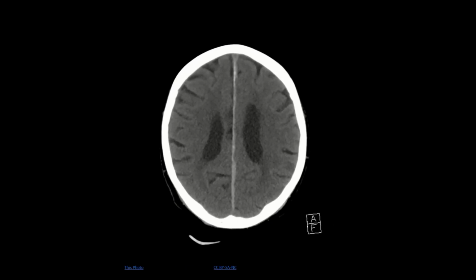So the first structure we're going to see is the falx cerebri. If you look at this white structure right here at dead center, that is the falx cerebri. As you all know, it separates the two lobes of the cerebrum, and this is very important in the context of CT in two conditions. The most important of these is the mass effect, which we'll be covering in future slides, and in the case of a meningioma.